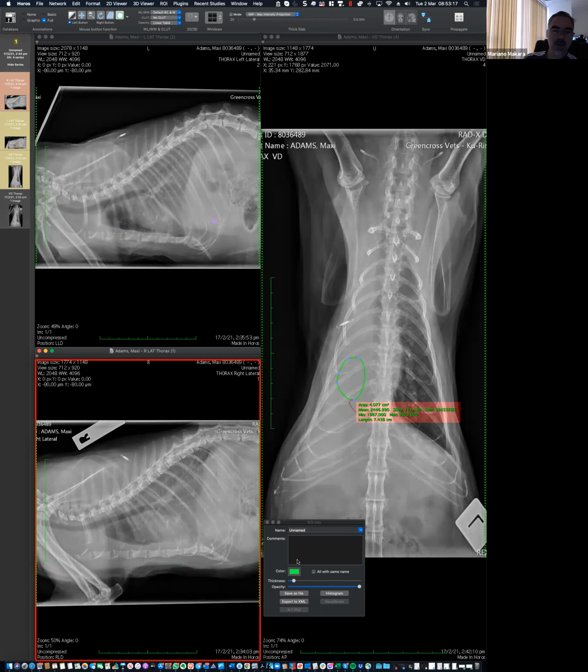Makes sense for a radiograph. That white in that right hemithorax is the same regardless if it's pleural effusion, if it's a completely fluid-filled lung, if there's a mass within the lung. For the X-rays that are going through those tissues, that interaction between the X-rays and those tissues is the same for all of them: effusion, mass, something in the lung.